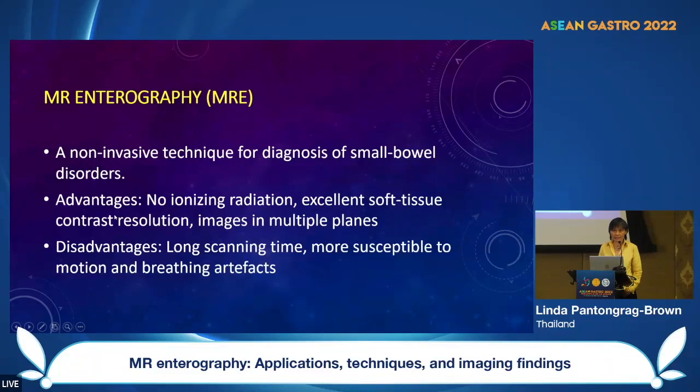But there are some weaknesses, which include long scanning time, particularly when compared to CT enterography. The technique is also more susceptible to motion and breathing artifacts, which sometimes gives images that are not so easy to evaluate. Having said that, it is really a very good modality for evaluation of the small bowel.